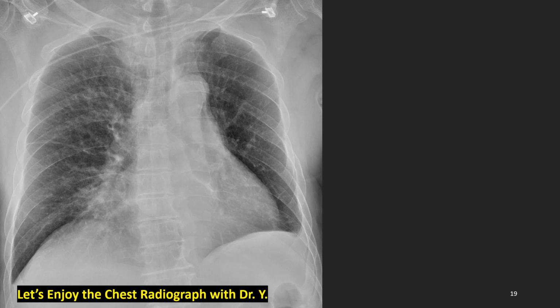What does this mean? Is it the right middle lobe? Yes, I know your answer. This is partial involvement of the right middle lobe. Maybe medial side involvement, so it is medial segment pneumonia of the right middle lobe.